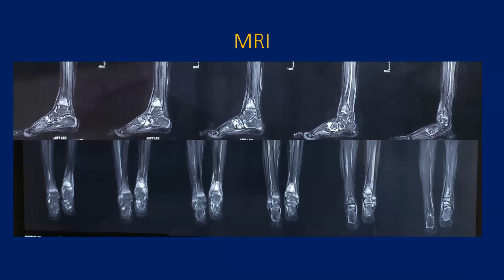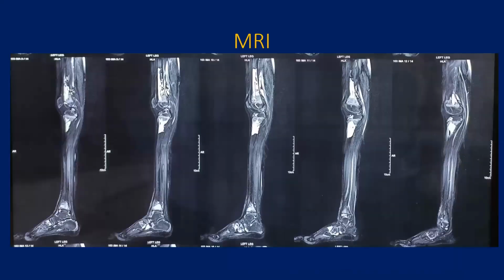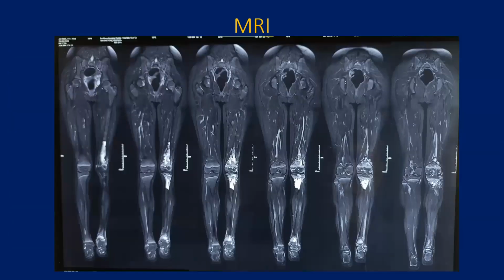Let's look at the knee MR also. Go ahead with the knee. But this radiograph is... Now it's a full image. I'm sure you want to see all the other images, but do we have any coronal? Yeah, here it is.